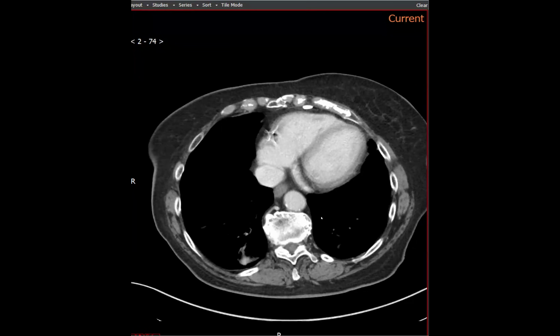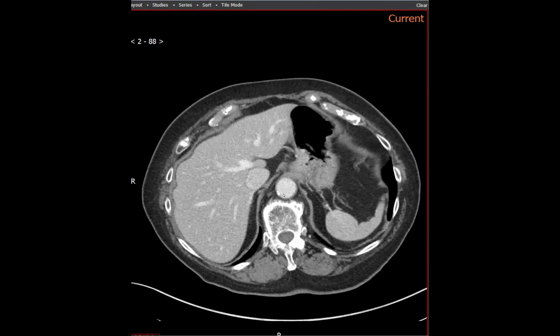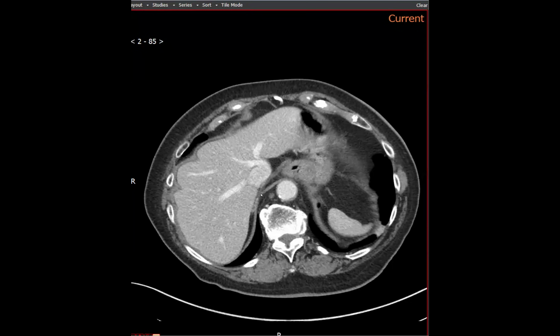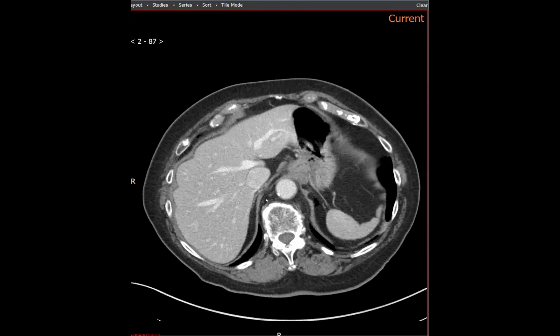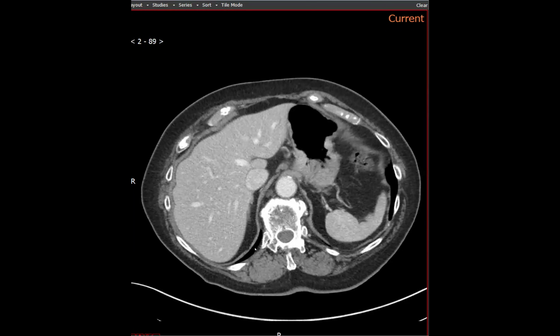So, incidental finding on this case. Do you guys see my screen? Yeah. There's the linear thing, anterior to the diaphragm crura. Or it's like a vessel or something. And then it goes from.